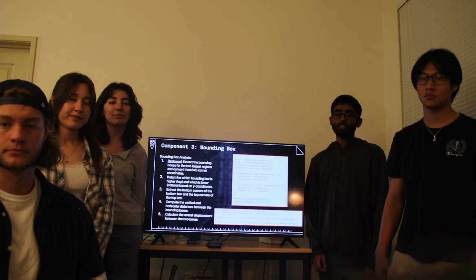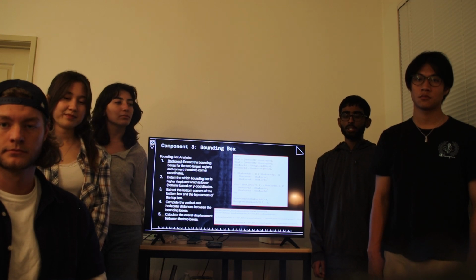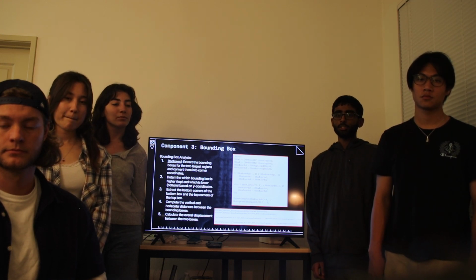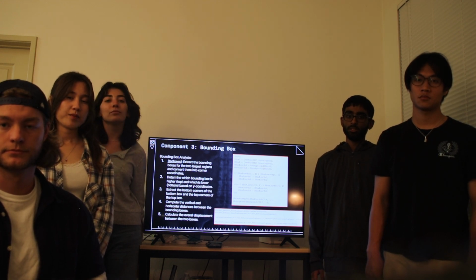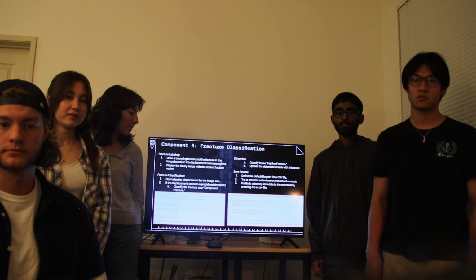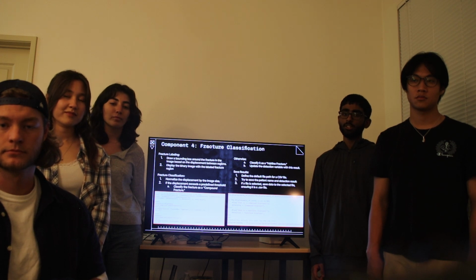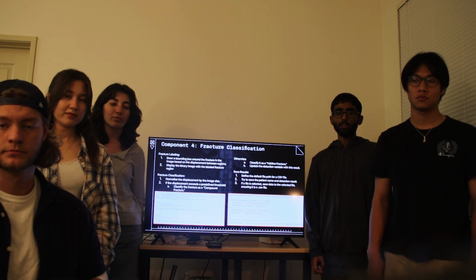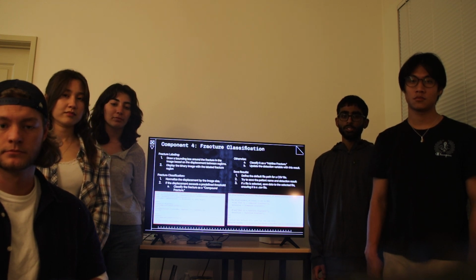After that, we extracted the corners of said bounding boxes, the coordinates, and found the vertical and horizontal distances between the intersection of these bounding boxes to determine where the fracture is located. So we then labeled the fracture by drawing a bounding box around the intersection of the two big bounding boxes, and we displayed the binary image with the labeled fracture.